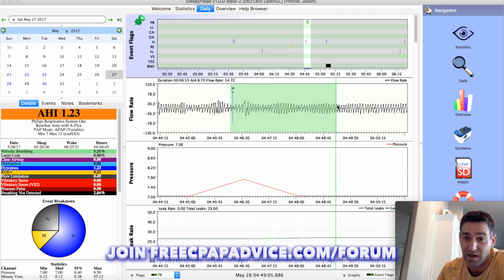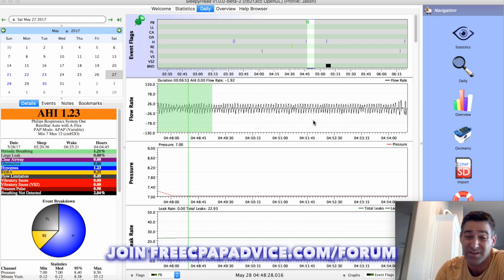Quite honestly, this is nothing, but it's being tagged as that, so don't freak out if you see it for really brief periods like that. If you see it going on for like 10 minutes, yeah, that's something to take note of.